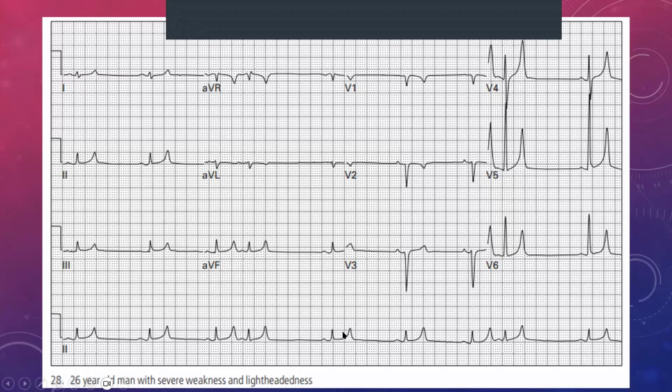And if you look at them, it's about 1, 2, 3, 4, 5, 6, 7 nearly. So, if you take 300 divided by 7, you're getting quite down there. You're getting into the 50s. So your patient is quite bradycardic, and your patient is experiencing lightheadedness. So chances are your patient's also got a bit of a low BP and hypotensive and things like that. So let's have a look and see.